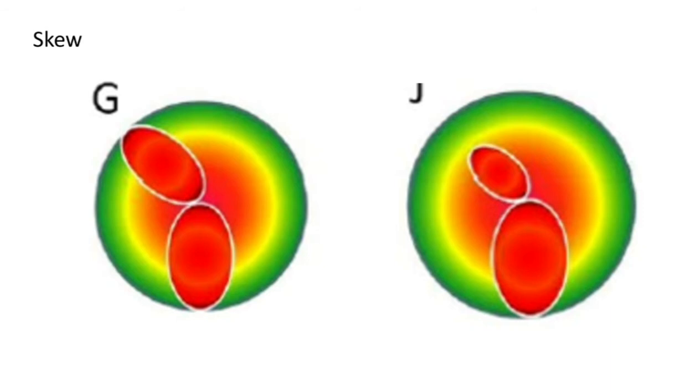This is the skewed pattern, where you can see a symmetrical bow tie with skewed radial axis that is anticlockwise, and this is also an anticlockwise asymmetrical bow tie with skewed radial axis. As you can see, this is one meridian and this is another meridian. There is a specific angle between these two meridians, like here and here. Always remember that in a skewed pattern the angle should not be more than 22 degrees. If it is more than 22 degrees, it indicates some abnormality. In the asymmetrical bow tie also, if there is a skewed axis, you need to look at the angle in the report.